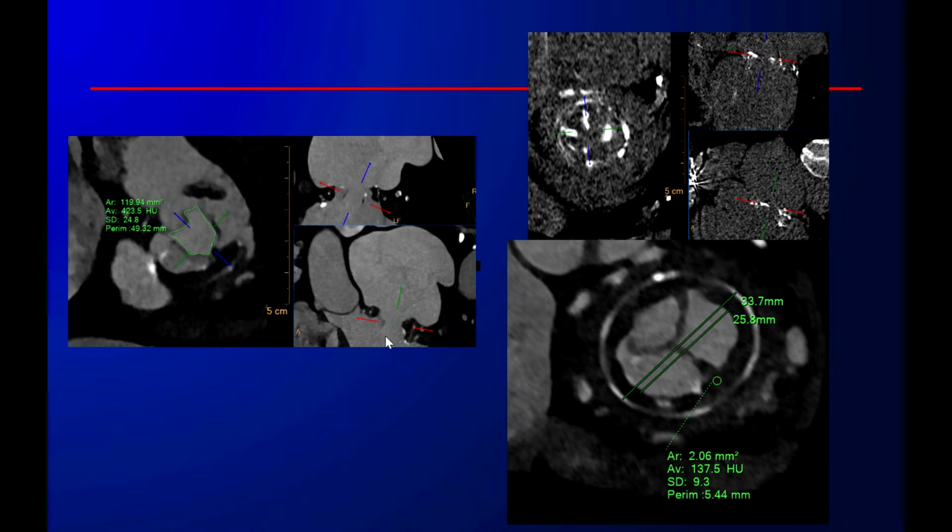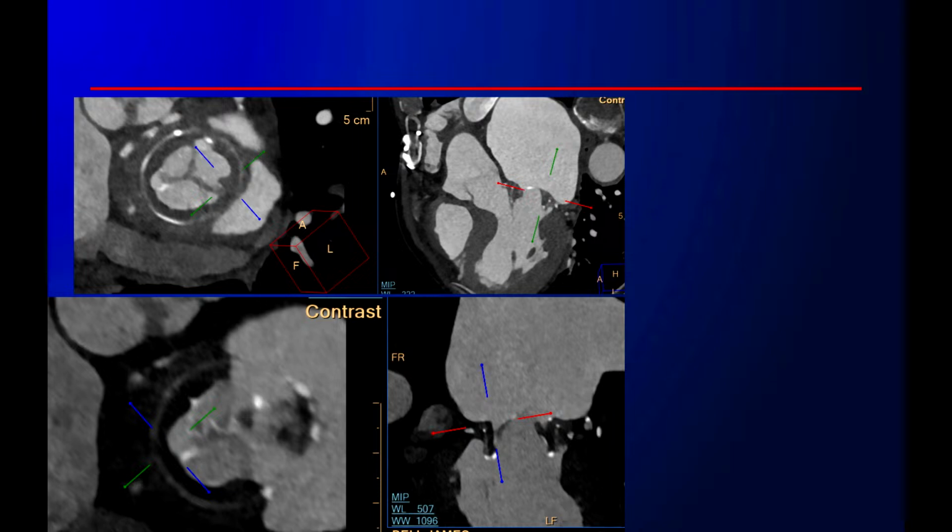Notice, different from the native valve, the narrowest opening is not always at the tip, okay? So in this case, as you see, this is fully open. Essentially, it's like a tube rather than a funnel. So the valve area would come out about 1.2. I think that might be a little bit closer to what reality is, personally. Probably not less than 1. It definitely, I think, is less than 1.5. So what's the cause of maybe moderate to severe stenosis?